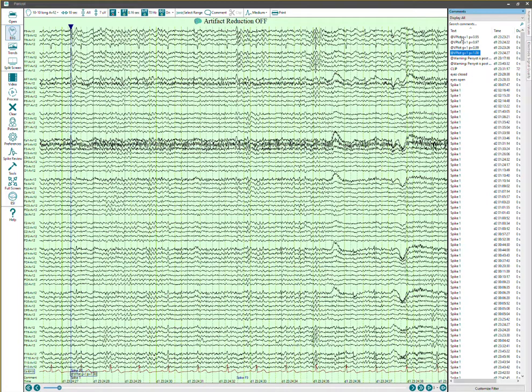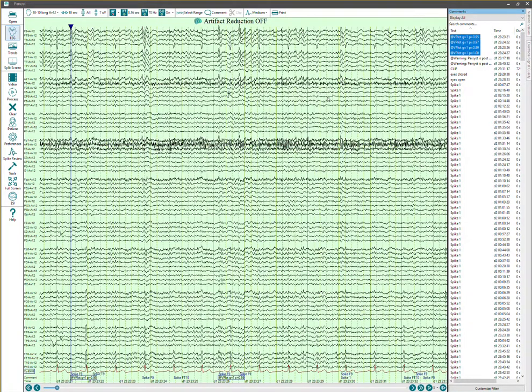And so that resolved that, and we were able to use that EKG channel in deciding whether we were going to mark that or select candidates from that particular spike cluster, or say, well, that cluster's from EKG, and I'm not going to mark that. We went ahead and we picked several from a candidate group, and we saved those as vplot comments, and this is what you can use in the final analysis, in whatever analysis you want to do from there. And I have a separate screencast that goes over the use of vplot.